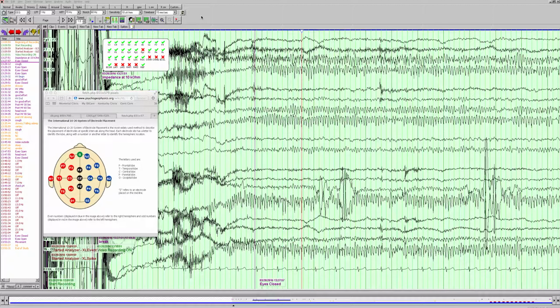This isn't something that you could pick up within a few weeks like you can during regular rotations where, at the end of a month, you feel like you're pretty confident. EEG is very difficult. There are a lot of subtleties, and do not get frustrated and don't expect to know everything right away. It just takes time and practice. So let's go ahead and start looking at our first study.